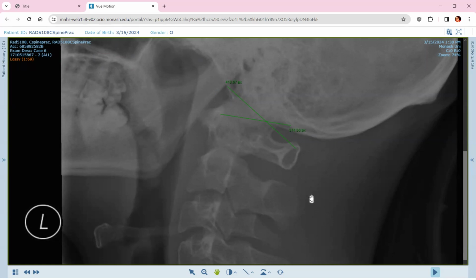Now, unfortunately, as these images are JPEG images, you don't get millimeter measurements, so I've actually gone and measured it. The first line came to 3.1 and the second line to 2.8. If you divide that, it gives you a ratio of 1.1.